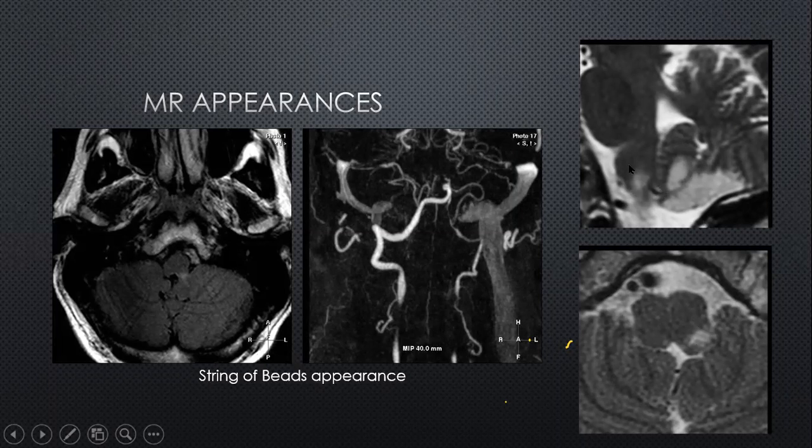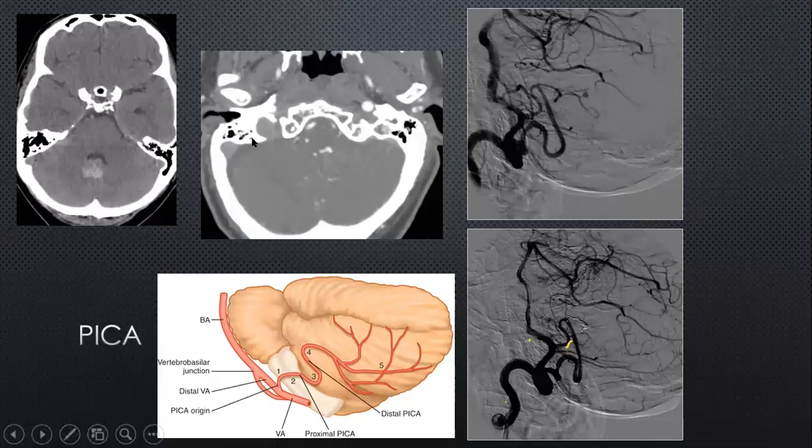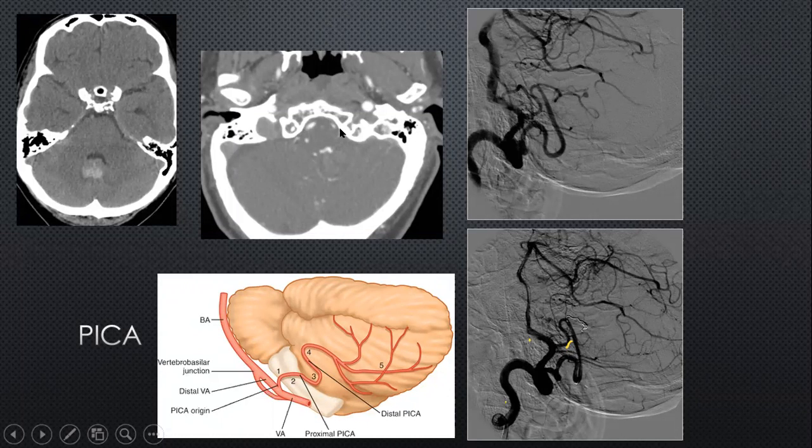So this is a patient with Wallenberg syndrome resulting from PICA occlusions. I was talking about looking for distal aneurysms. So this is a patient with a vermian hematoma, who also had a fourth ventricular clot, and you can see how the aneurysm is much more distal, rather than the more traditional aneurysms that we are accustomed to seeing much more on the surface of the brain, if you like.